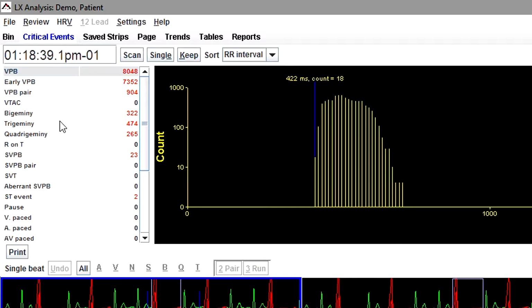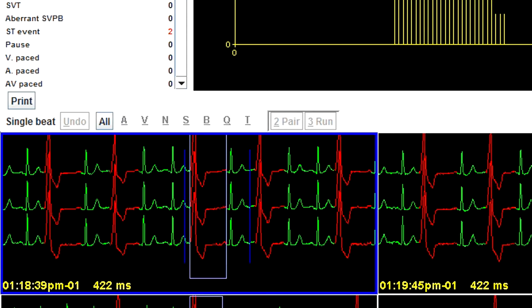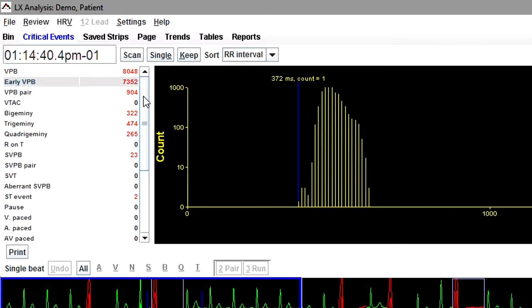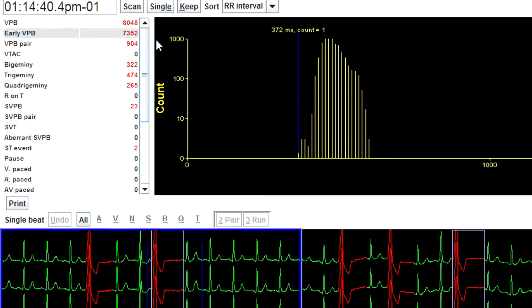Every event of each type could be displayed either one at a time, full-sized, or 12 at a time, miniature. To select a type to be displayed, use the scroll bar to scroll through the list and display your choice, and then click on your selection.